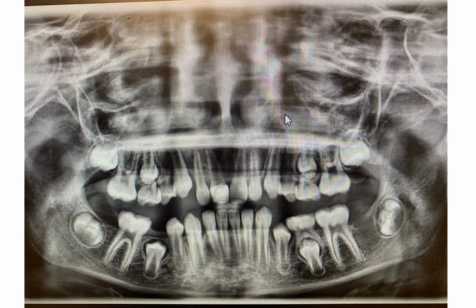I think at first it might be difficult to realize where the lesion is, but having mentioned that, if you pay close attention, you're going to see this radiolucency between these two teeth. Even if you fail to see the radiolucency, I hope you saw the increased interdental distance, which is important in this case.